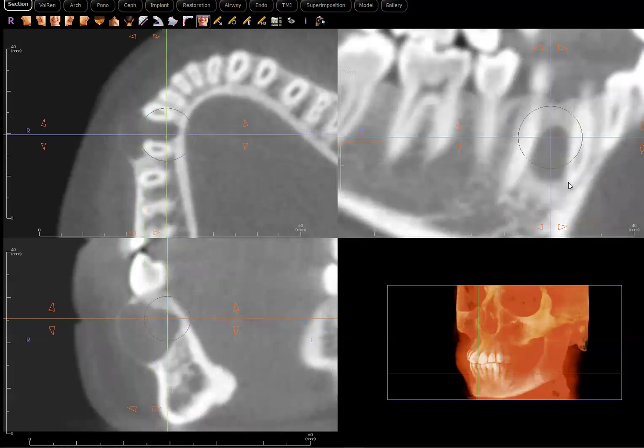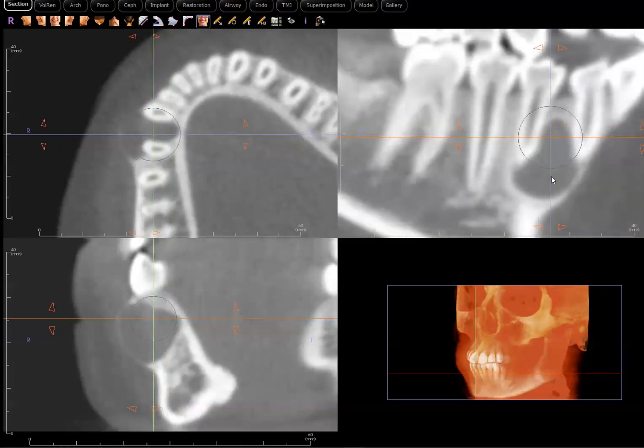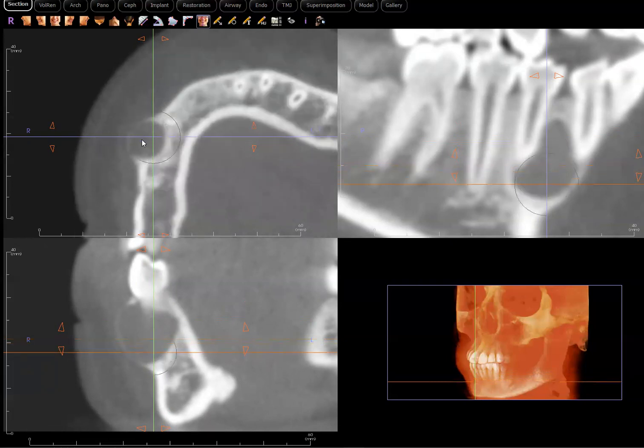one could consider, I think, odontogenic keratocyst, but it could also be a lot of other benign odontogenic tumors. The final diagnosis, of course, is shown in the title, which is AOT, Adenomatoid Odontogenic Tumor. But this is an especially difficult lesion to come up with a diagnosis based on the radiographic features alone, because the classic radiographic representation of AOT, adenomatoid odontogenic tumor, will show internal calcification, typically involving the crown of an unerupted maxillary, say, canine. But here, all teeth are fully erupted, and internally it's completely radiolucent.